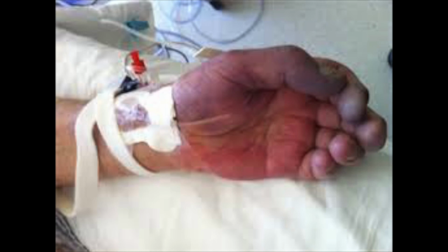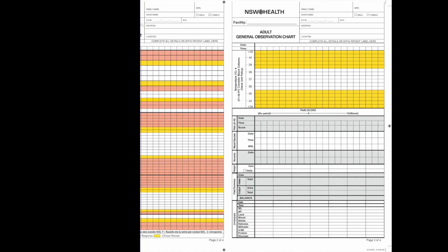Another important thing to remember is that if a patient has an infection over the proposed catheterization site of the artery, this is a contraindication for the implementation of an arterial line. Some machines allow for continual trending of vital signs and measurements that are taken by an arterial line. However, it is important to take note of measurements at regular intervals to assist in the early identification of ongoing patient condition, trends and pathways.